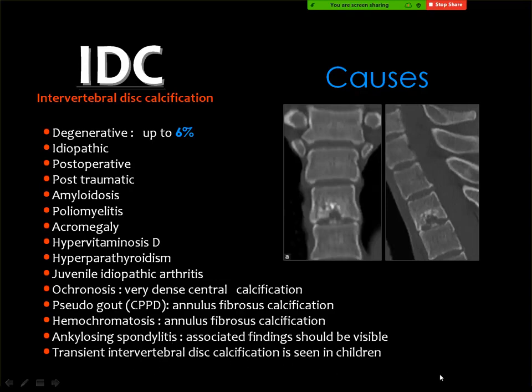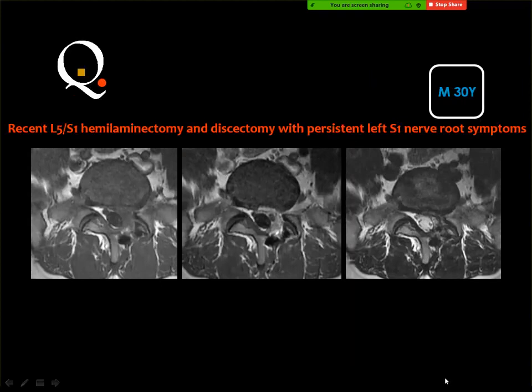You mean that you got some calcium in the disc that resolves spontaneously after some time in the pediatric age group. Next case.